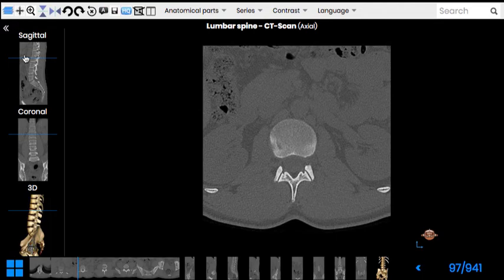It's easy looking at this image here. On my left upper angle, you see the sacrum just below, 5 fused vertebrae with the coccyx attached. And the first IV disc is the one which belongs to L5. So we call the vertebra above L5, and the disc below it belongs to it. It's the IV L5. The next one is L4, and the vertebra is L4, L3, L2, L1. So I'm now at the level of the L2 vertebral body.